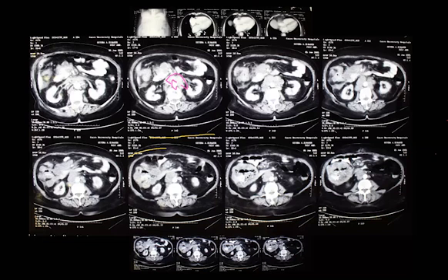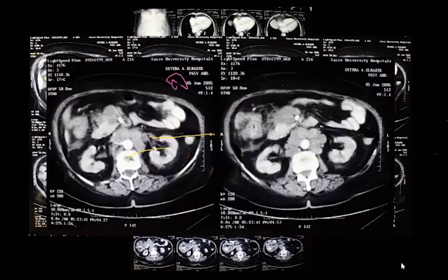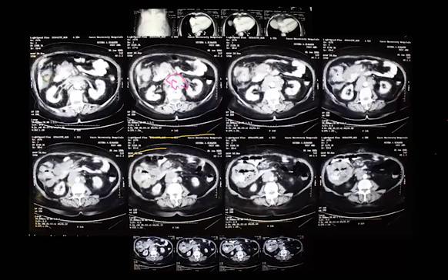Can you put a differential diagnosis for these structures? I don't know, maybe arteries. Maybe arteries. Something else? They look bilateral and symmetrical. Project them downward and see at which level they go. If you project them downward, maybe it's not visible here. Yalla, any other suggestions of opacifying, bilateral structures on the outer side? Any other suggestions? Just suggest. Think about them. What will opacify? How will you think about the nature of this lesion, of this anatomical structure?